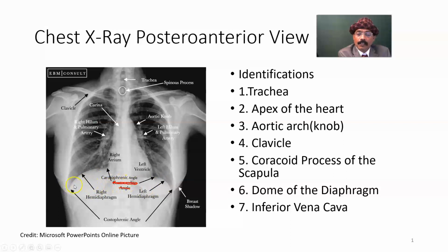In some pathological conditions, there may be a collection of air underneath the dome of the diaphragm, a crescent-shaped gaseous shadow, in case of intestinal perforation, after abdominal surgery, or peptic ulcer perforation. There may be gas underneath the dome of the diaphragm.